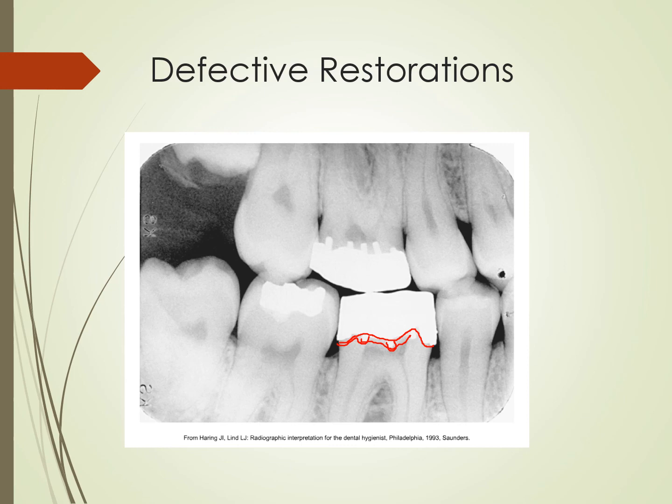and over time it'll cause bone loss around that tooth. The same thing is happening up here. You can see this crown way out here, and then it kind of comes around and it comes here. The front of this one actually is really nice, but the back side is kind of not great. And then you can see here these little pins sticking up. These are metallic pins or retention pins.